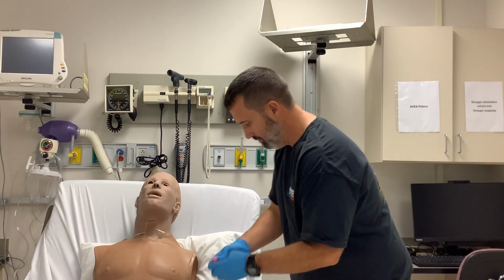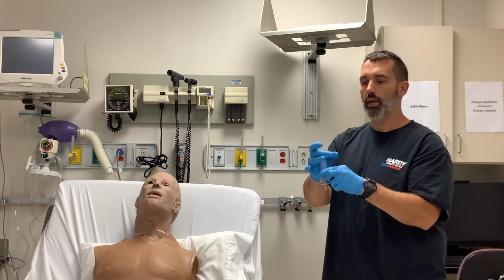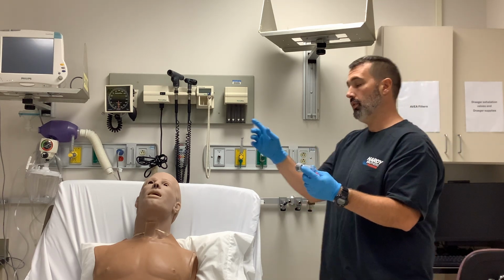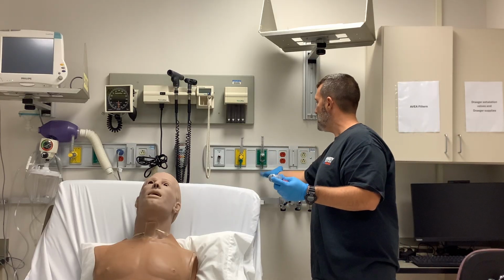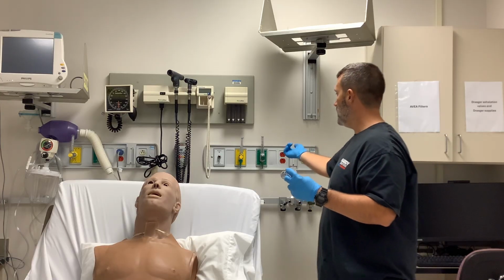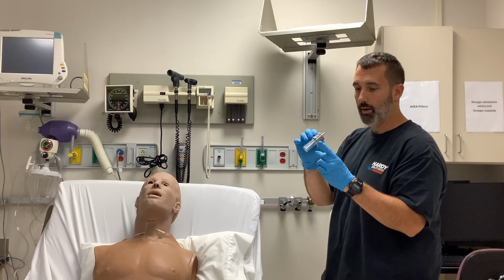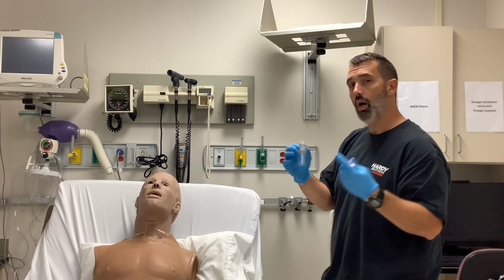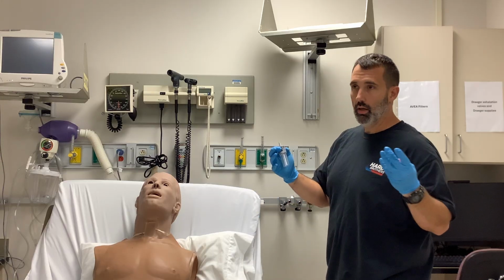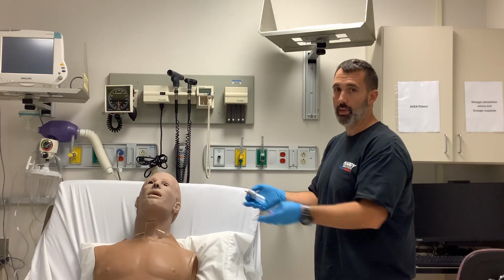What you'll notice is if I'm utilizing this apparatus, the corrugated tubing slips over this end, the oxygen tubing goes over this end, and then the other end of that obviously is going to attach itself to the oxygen flow meter. And then you can adjust your liter flow based upon the recommendations listed by these devices here, or if you understand the system, you can ultimately titrate to make sure that you are meeting or exceeding the patient's peak inspiratory flow demand.